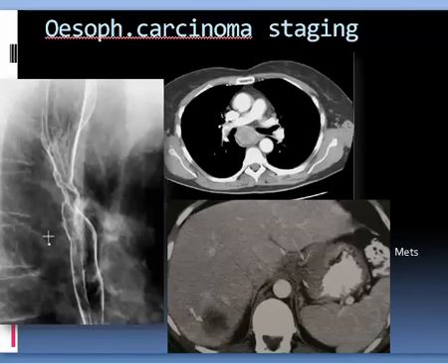Here is another irregularity, oesophagogastric or distal esophageal, mid esophageal, distal esophageal. Esophageal carcinoma at the middle with mass, and this mass is filling the lumen, and the mucosa is seen irregular, and here there is definite deposit, so denoting esophageal carcinoma. How to stage this?